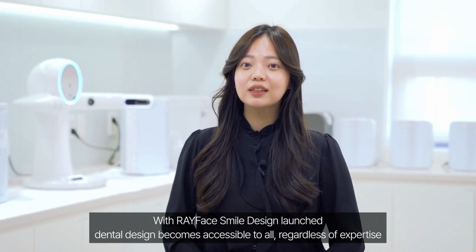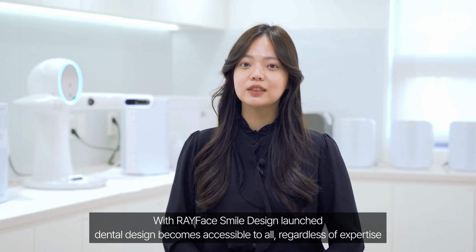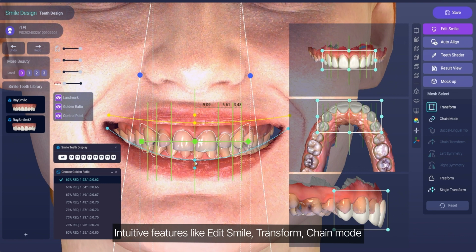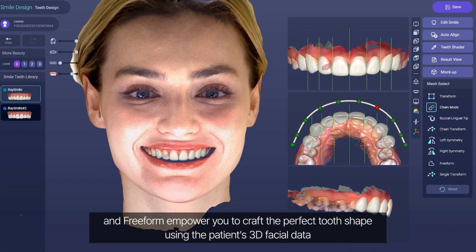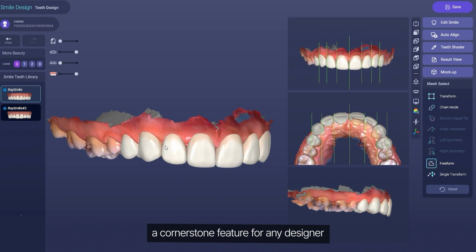With RAYFace Smile Design launched, dental design becomes accessible to all, regardless of expertise. Intuitive features like Edit Smile, Transform, Chain Mode, and Freeform empower you to craft the perfect tooth shape using the patient's 3D facial data, a cornerstone feature for any designer.